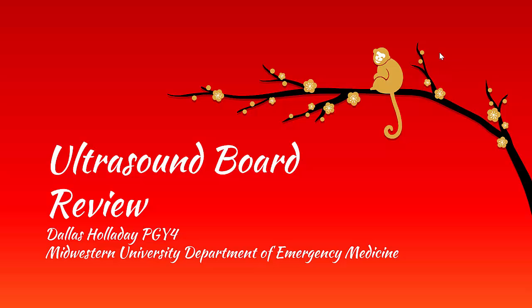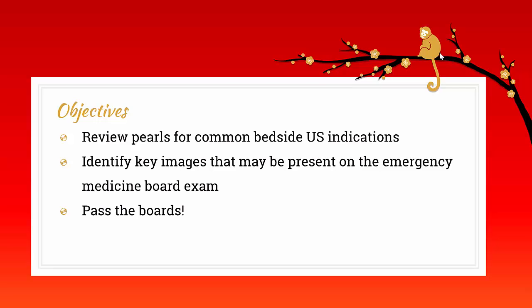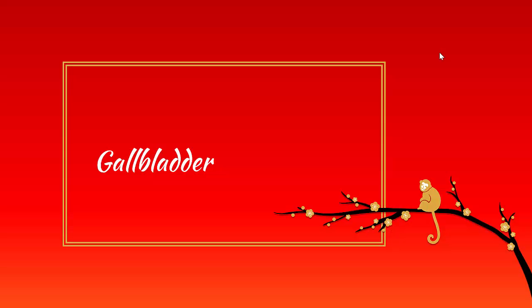Ultrasound images are becoming more and more common on board exams as well as in real life. So the following presentation is going to cover some key images and pearls to help you pass all your ultrasound questions on your board exam. As far as lectures, we're going to discuss the pearls and common bedside ultrasound indications. We're going to identify some key images that might be present on these exams. And as always, we really want to pass those exams.